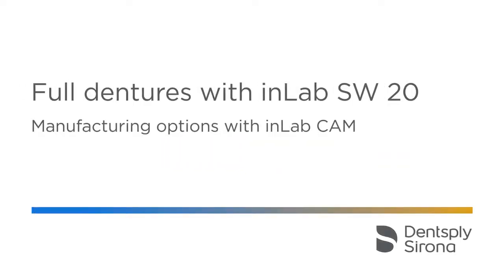Welcome to this video tutorial covering full dentures with inLab Software 20, manufacturing options with inLab CAM 20. In this video, we will show you how to produce full dentures with inLab CAM 20 and the inLab MC-X5.